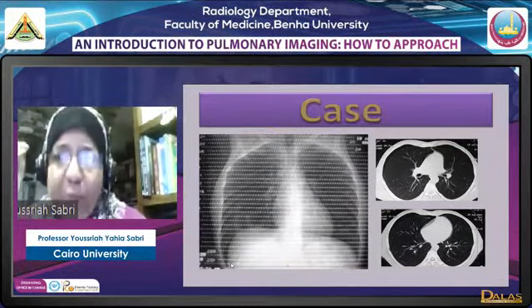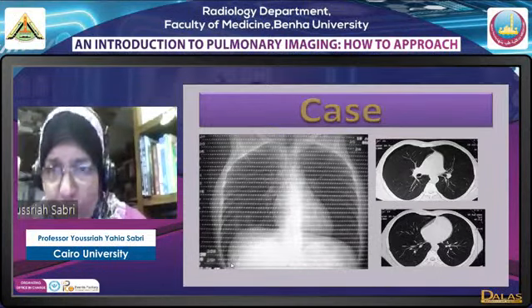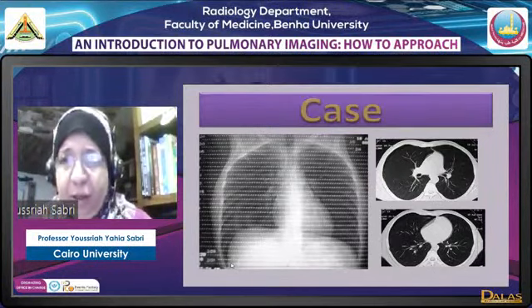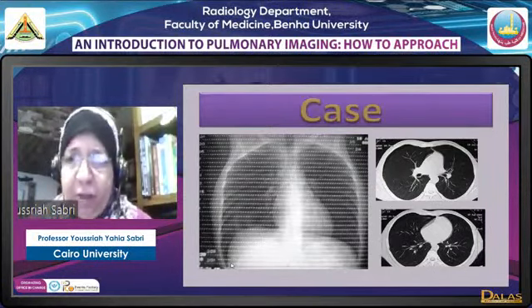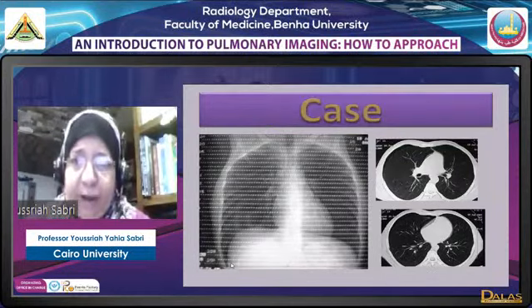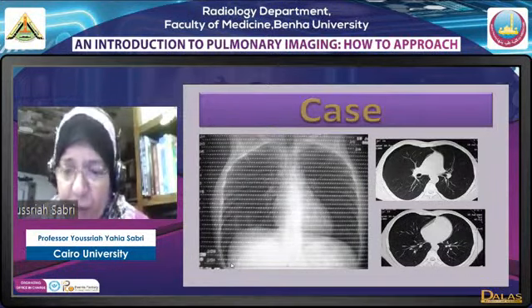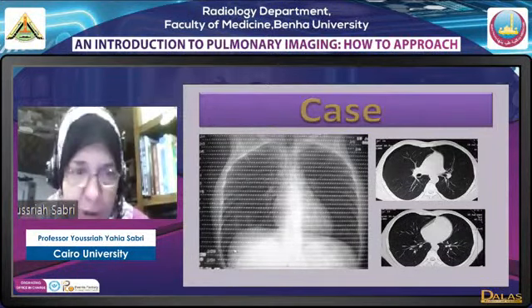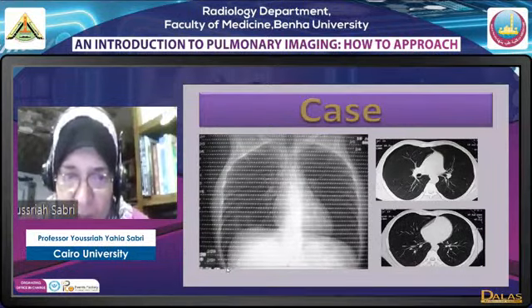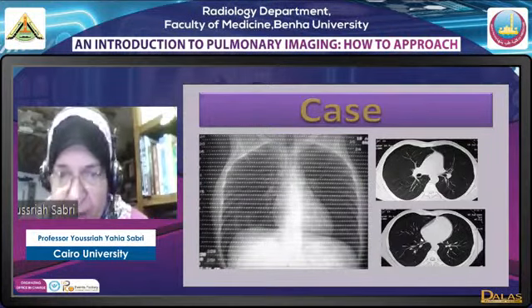It's extremely important to know how to diagnose pneumothorax, hydropneumothorax, and effusion in a supine patient, because this will happen in a case of trauma, post-operative, or a patient in the ICU. All of these patients cannot stand. And if you don't diagnose such entities in those patients, you will miss them and cause marked harm to the patient. This is a deep sulcus sign where we have a very deep going down costophrenic angle. And this is how we see the pneumothorax in this patient.